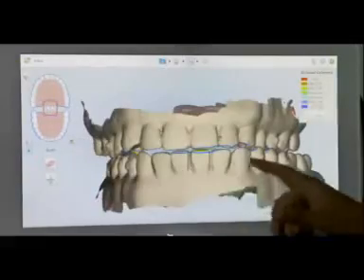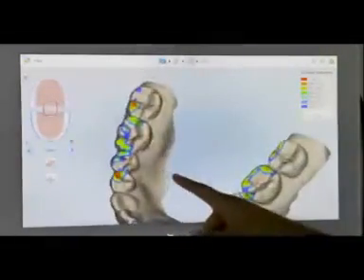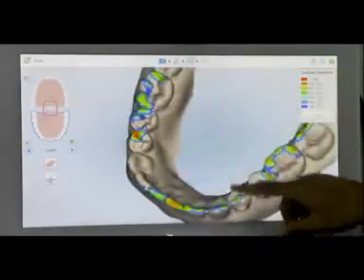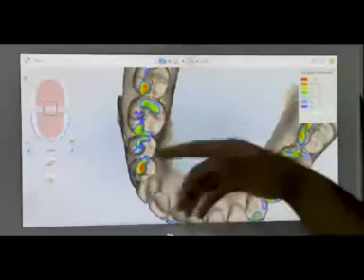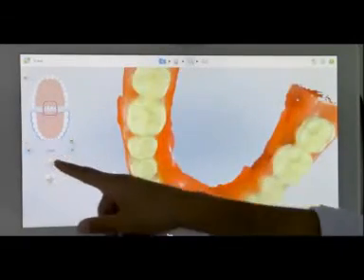On here you can see stuff like the occlusal clearance. So if I did that. This is really important if you're working in combination with the dentist and you need a certain level of clearance to put an implant or an abutment or whatever. You've got this kind of graph there. You can change that.